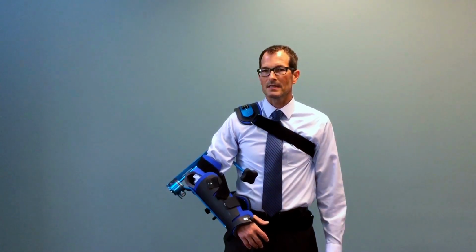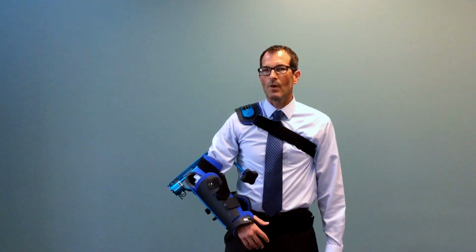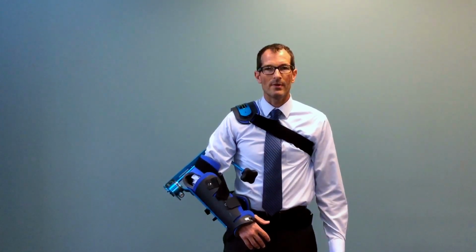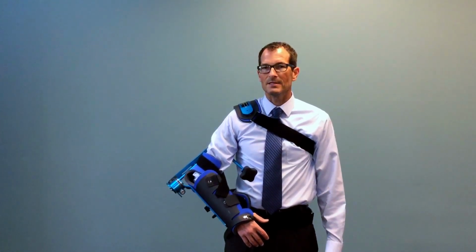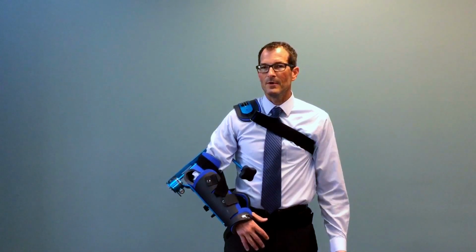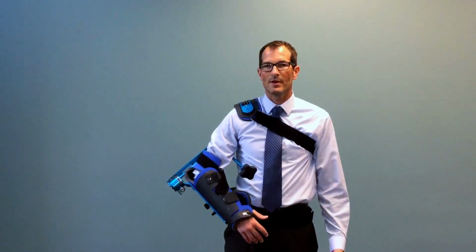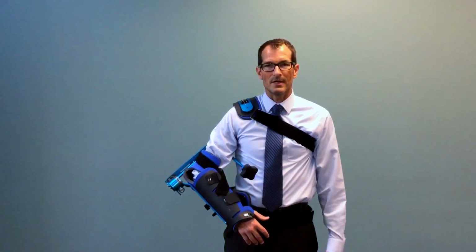The reason for this is because Dr. Donatelli basically proved that for every 1 degree of external rotation you gain 1 to 1.5 degrees of shoulder flexion. Dr. Donatelli is a PhD in physical therapy. Numerous therapists utilize his textbooks and resources when they're being trained in school, both PT and OT.